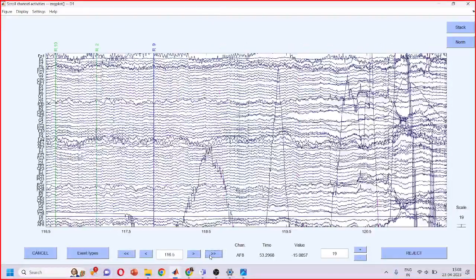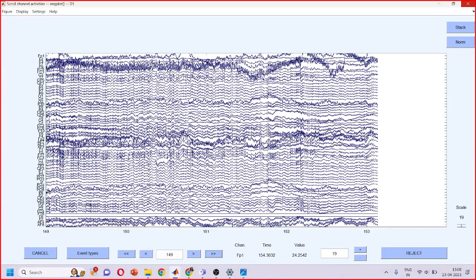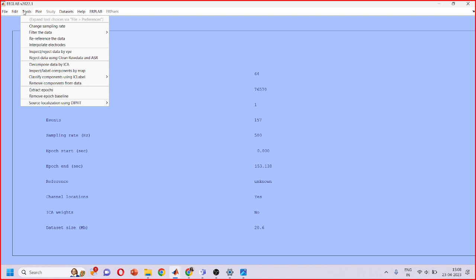This is the whole data, and yeah, again, the bad segments are here. So I didn't want to take the online databases because they are pretty clean usually, and it's not very interesting to work with them. These kind of data sets, which are real world, really seem to be teaching us a lot of things, because errors actually teach you a major part of the learning, rather than the idealistic data sets.